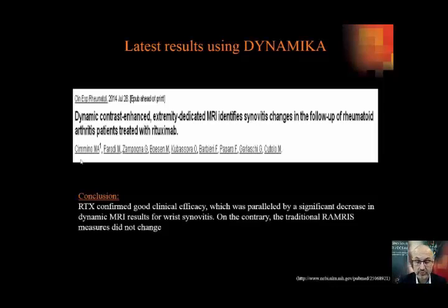Recently, this year, it was also published that the dynamic MRI curves identified the patients that had a clinical response in a better way than the conventional static scores. So it seems that if you've had the disease for some years, the static score doesn't change as much. This is particularly an area where the perfusion curves seem to make a big impact on interpretation of treatment response.